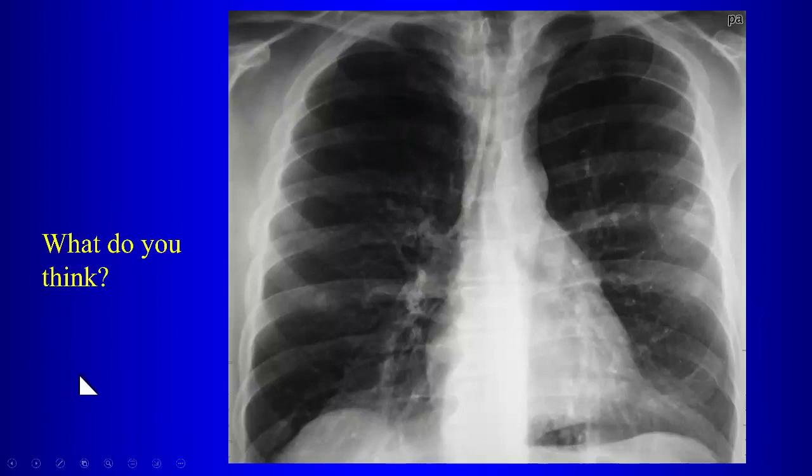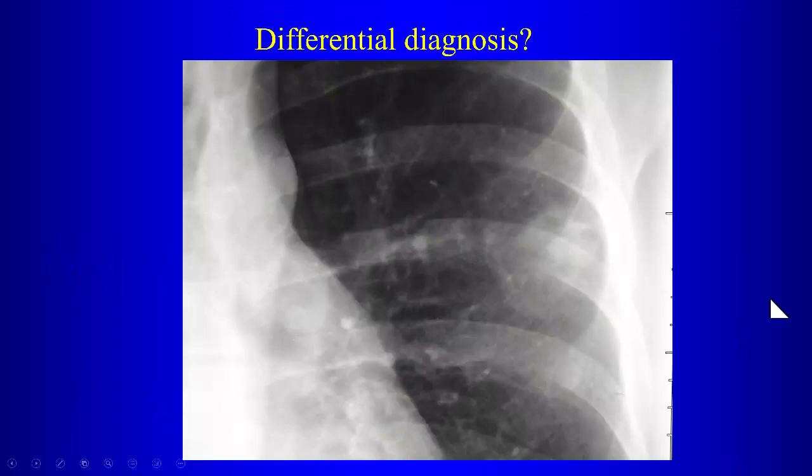What's the abnormality on this chest radiograph? It's like there's a left mid lung opacity. Yeah, so we have this left mid-lung opacity. Here's a close-up. Anything else to say about that? There's internal lucency. Yeah, so the lucency could represent what? Cavitation, right. So if we see lucency within any kind of nodular opacity, we think cavitation. So what could this be? What's the differential diagnosis? So, presumably for neoplasm, squamous cell cancer is the most common neoplasm associated with cavitation.